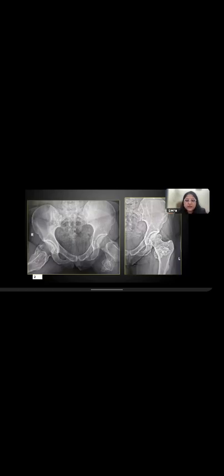Correct, correct. Very good. This is very rightly answered: osteochondroma of the neck of femur, and this is a benign, touch-me-not lesion. But what do you think the patient presented as? The patient presented with pain. And why is the pain happening? Because now the osteochondroma is growing. The cartilage cap on this started growing and it started irritating the neurovascular structures, and that's why the patient started having pain.